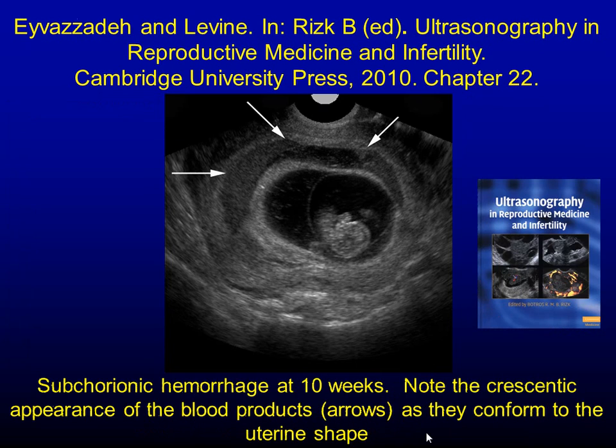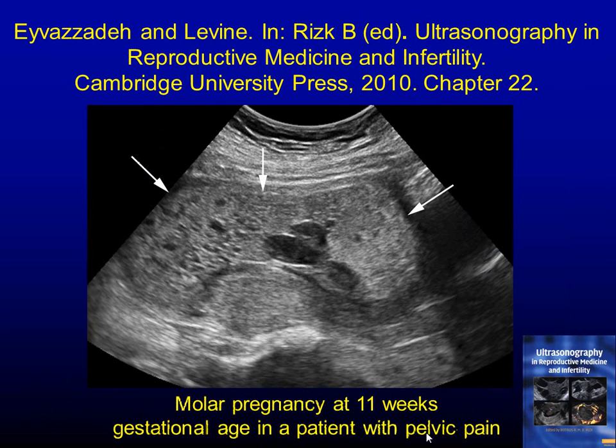Intradecidual sign, subchorionic hematoma, very, very common. The subchorionic hematoma, unfortunately, increases the odds of miscarriage. How much, nobody knows. What is the size, nobody knows. But certainly subchorionic hematoma is associated with a higher miscarriage rate. Many of them continue. If you look at women who bleed during pregnancies after ART, 15 to 35% will bleed in the first 12 weeks in women who continue and deliver a normal baby at the end.